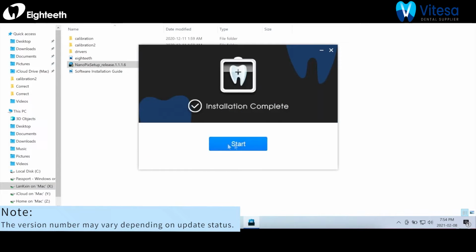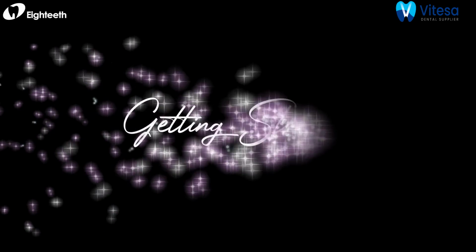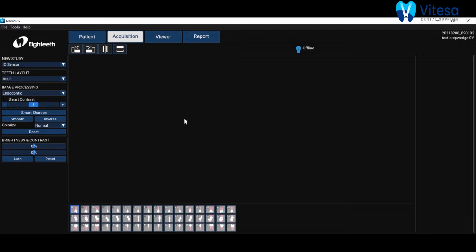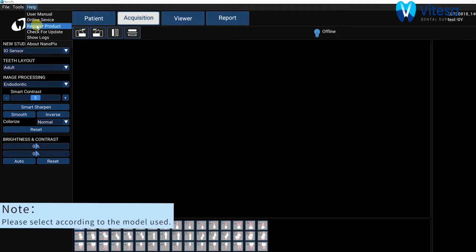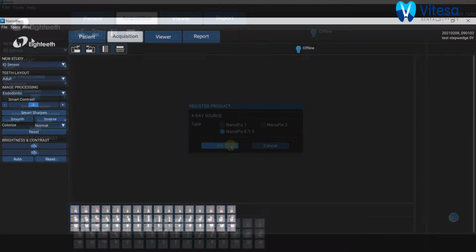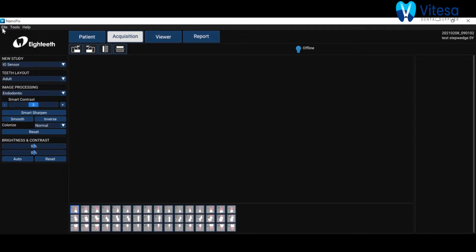All right, and now we're done. Okay, so here we are. We're into the software. You made it. It's such a great, simple, effective software to use. So let's just go ahead. I want to walk you through a couple things.